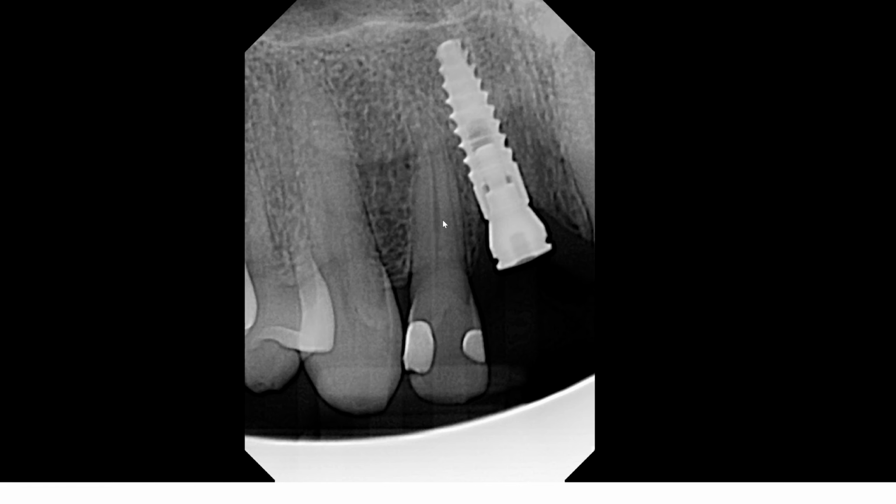It's clear to all of us that in this interradicular distance, this implant has been placed more distally toward number 7, such that the distance that I can measure here, although my ruler currently is not calibrated for this radiograph, I would presume is anywhere around maybe a millimeter, maybe slightly more, but it's very close. That I think we can all agree.